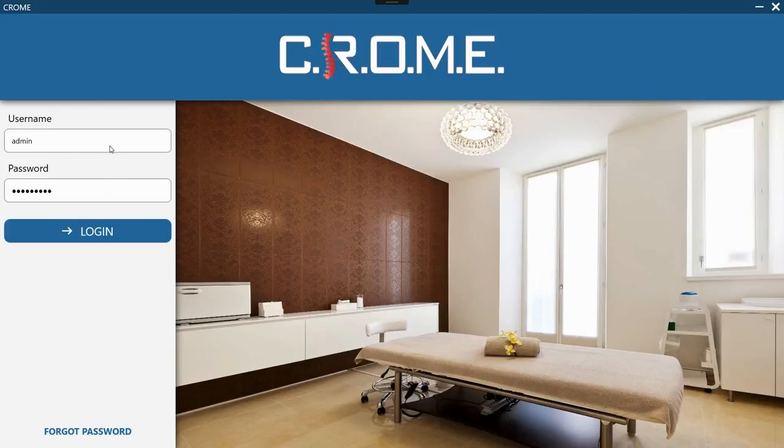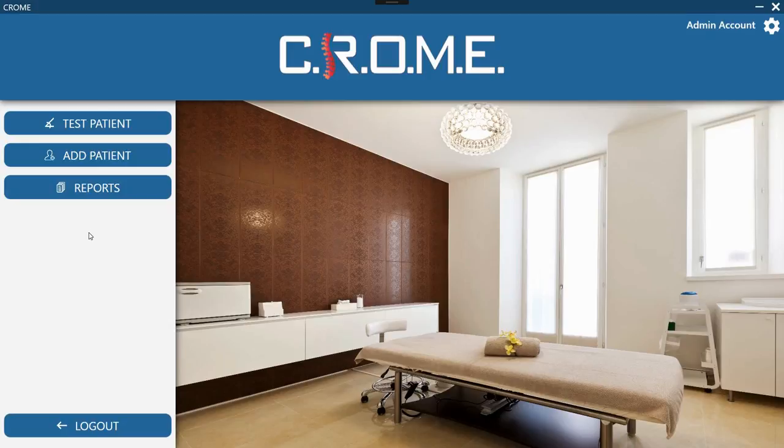In this video, we're going to go over the functions of CROME, as well as how to use it. First, you'll log on with your username and password. After that, you will be given the options to test patient, add patient, or view reports. In order to test the patient, you must first add the patient's information. At any time, if you want to view the reports, you can also click on Reports.